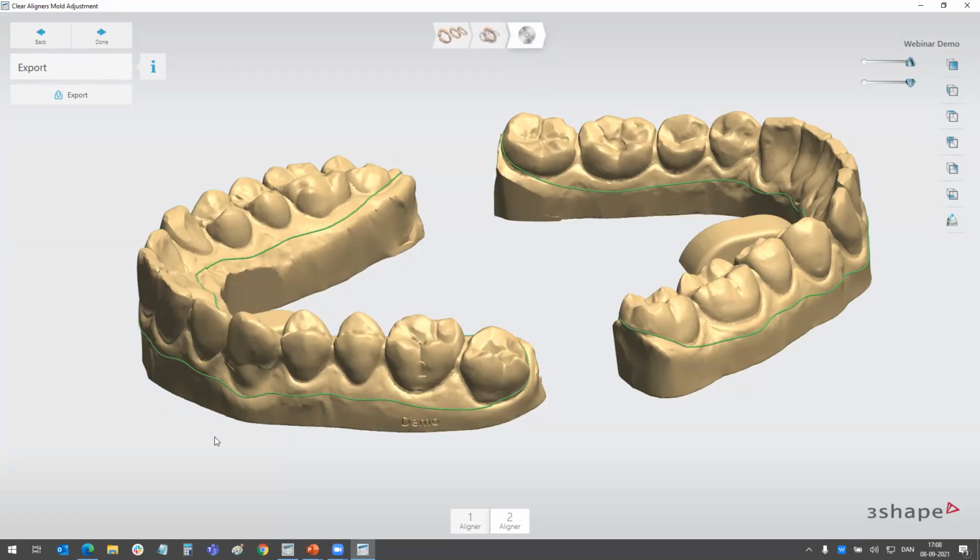Some of them have built some automatic logistic scripts to move files around to the printer. All of that will still work out of the box with this new version of the software, as everything is named exactly the same. That actually concludes the demo. So we look forward to diving into some of your questions.